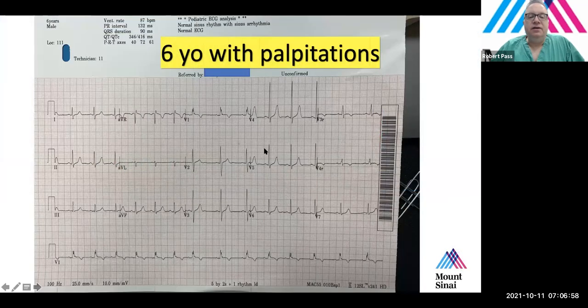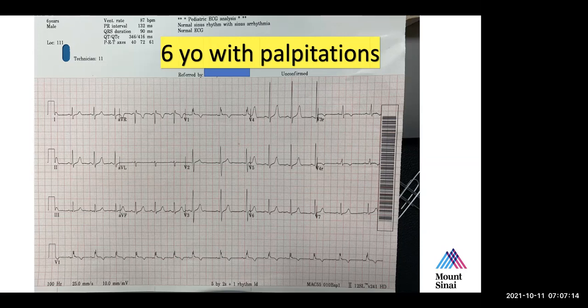Okay, this is a 6-year-old with palpitations, and I'm going to go to Dr. Zawani to ask him what he thinks about this tracing. Morning, Dr. Bass.